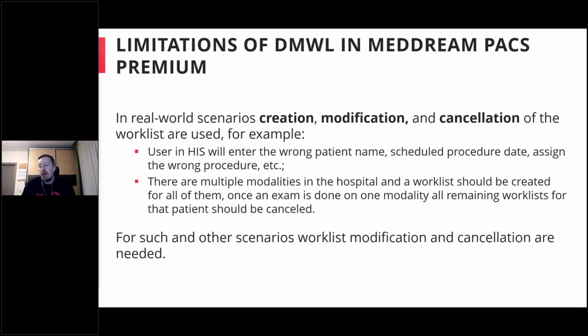Why I'm telling you about these cancellations and modifications is because usually in the real world scenario, the creation, modification, and cancellation are used together. For example, someone in the HIS system will order the exam for some patient, and maybe the patient name will be wrong, maybe the scheduled procedure date will be wrong, or the assigned procedure will be wrong, and the HL7 message would already be sent.